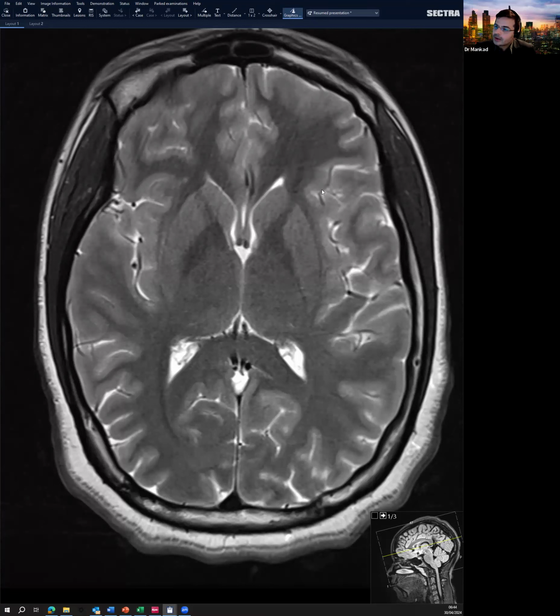But also deep within, you have the arrangement of the gray matter nuclear structures. This is the left side of the brain. This is the right side of this child's brain. Here we have the ventricles, the CSF-filled structures, the frontal horns, and abutting the frontal horn is the left caudate nucleus. Next to it is your putamen and the globus pallidus, which generally at this age appears a bit dark. They constitute the lentiform nuclear complex. Together, we are looking at the basal ganglia structures, the left side and the right side.